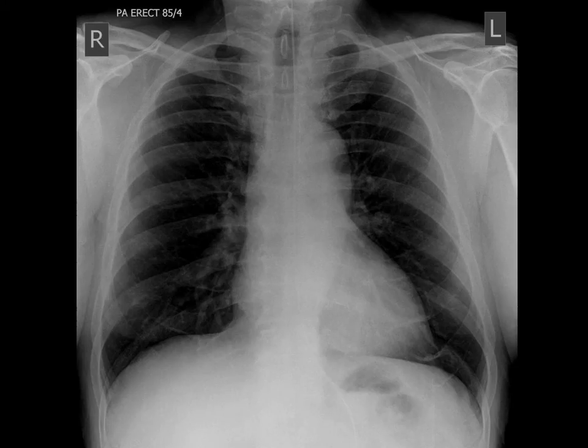This chest X-ray has a nasogastric tube that is correctly inserted. Its location is shown by the dashed line. The gastroesophageal junction is where the nasogastric tube passes into the stomach. The outline of the stomach may be identified by the stomach bubble.